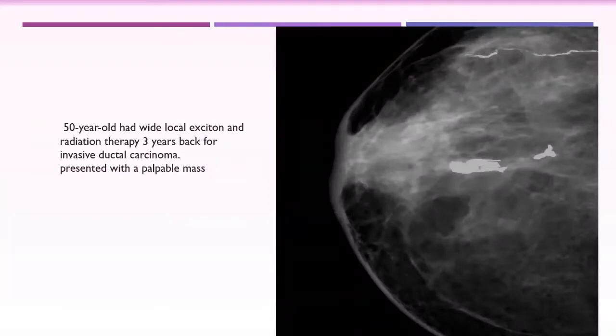The previous mammography is not available. Everything is normal except for these branching high-density opacities.